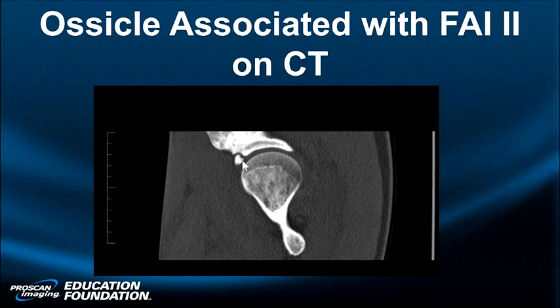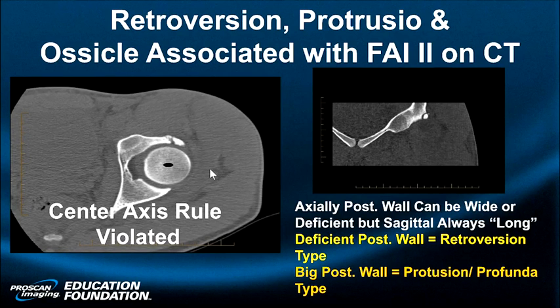There is a broken ossicle. No, it's not a congenital os acetabulare. He's got the crossover sign. You're up high. The anterior labrum should never protrude lateral to the posterior labrum. And then as you go down, this shrinks back. So they crisscross. This gets more lateral, this gets more medial. That's the crossover sign. This one broke off in hip flexion to create that ossicle. Another rule of thumb is the center of the femoral head should pretty much line up with the posterior bony acetabulum.